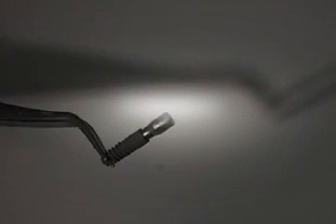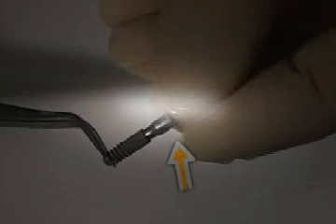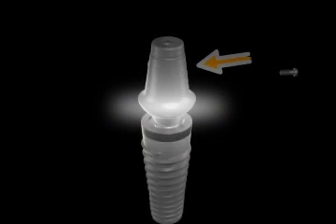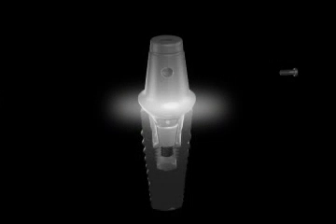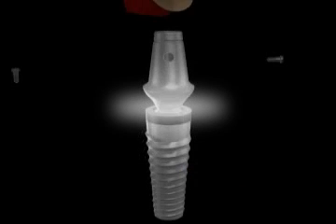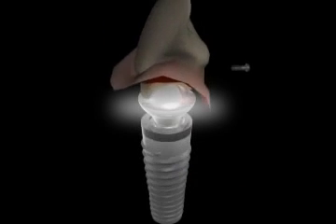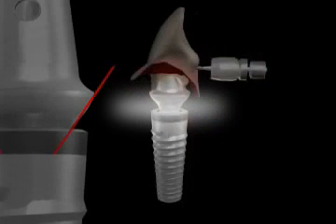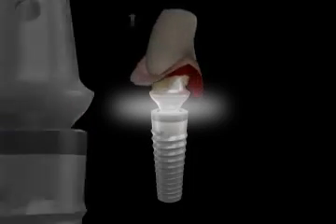The implant is usually located in the bone, and the crown is then attached to the abutment. Therefore, abutments are implant caps that function as a crown base. Normally, the abutments are attached to the implant and screwed on tightly. This means they are plug-in connections. Implant producers implemented conical connections between implant and abutment early on, which created a small difference with significant consequences.